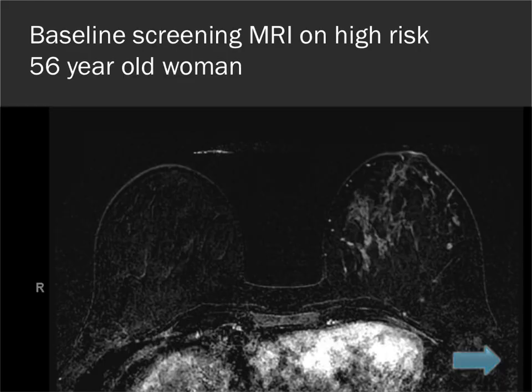So this is a baseline screening exam on a high-risk patient. I forget what she was high risk for, but you can see here there is a significant difference in the background parenchymal enhancement between the right breast and the left, and she had not had radiation treatment to her right breast.